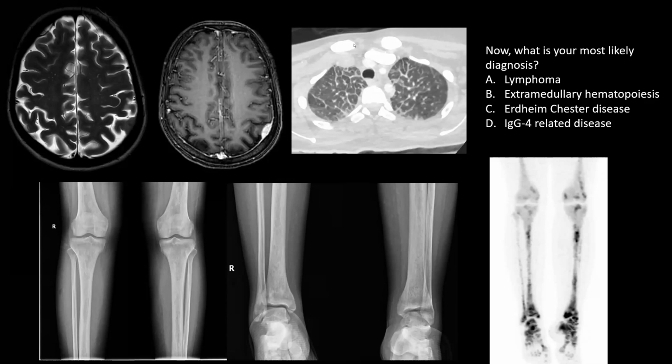Okay, so you can vote now. Okay, so now you're going mostly with Erdheim-Chester disease. Only a few picked lymphoma.